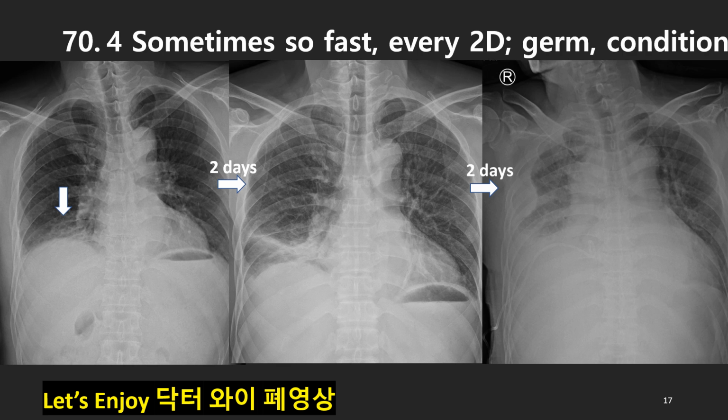The first one shows us right lower lobe consolidation pneumonia. 2 days later, we see progression to right middle lobe pneumonia, with exudate pleural effusion on right lower side. And 2 more days later, we see large, multiloculated, complicated pleural effusion. Even if we put in the pigtail catheter, the drainage effect was not so successful.